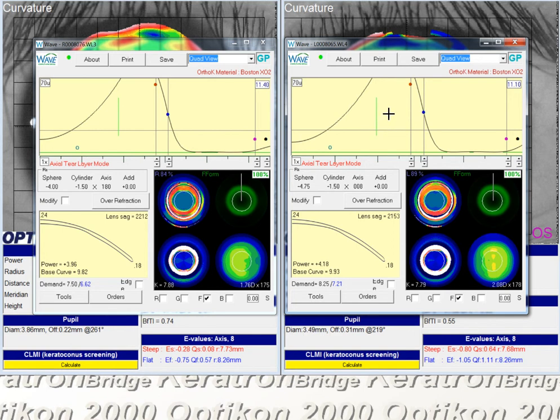And in order to get a 15 to 20 micron drop in maximum clearance, we would probably have to make the OZ too small. Even in kids, too small of an OZ causes them to not get very good acuity because we get too much plus from the reverse curve within the pupil. So I think in this case I would consider adding some asphericity to the lens. I'll work on the left lens since we have more clearance on that side.